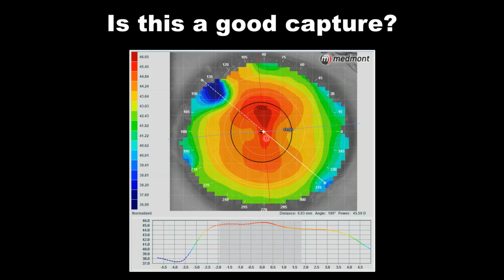But you'll notice as we move toward the temporal side, the eye has this very smooth and gradual rate of flattening that you see here. Whereas, as we go to the opposing side, it appears that the cornea has this sudden drop, or what you might call a divot, where the cornea has this curvature that has this sudden cliff that it drops off, and we have this flat spot.